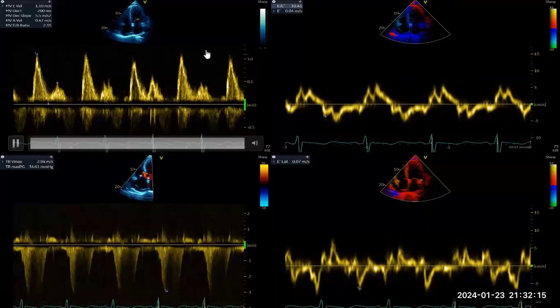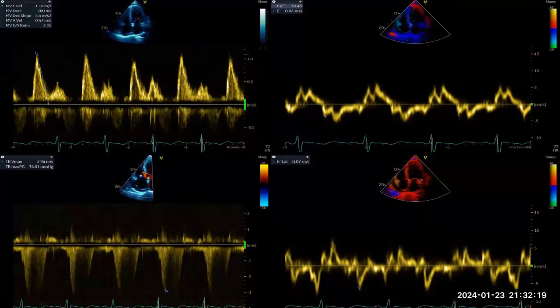Come on, one of you guys, may God give you health. Come on, it's an easy case. Just take your time. Take it one by one. Still, there is another 2D view. We can see it after. But I need somebody to tell me about these. I will take it, Dr. Yasser. Go ahead. Who is with me? Mshari is with you, Doctor. Welcome Mshari, go ahead.